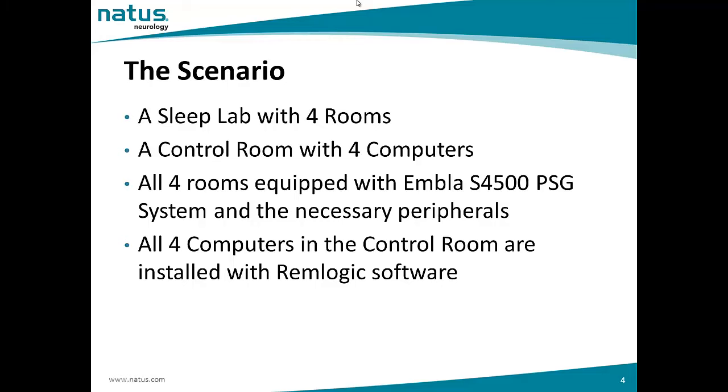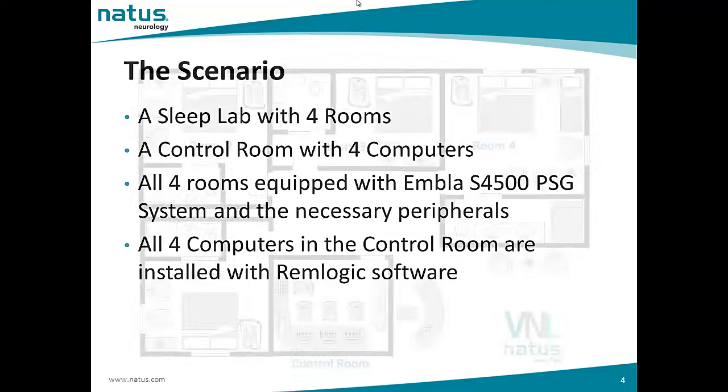Okay, let's start here. Let's have a scenario here. Let's say that we have a sleep lab with 4 rooms, and then you have a control room with 4 computers connected to the PSGs in the 4 rooms. All the 4 rooms are equipped with an Embla S4500 PSG system and the necessary peripherals. All the 4 computers in the control room are installed with RemLogic software.